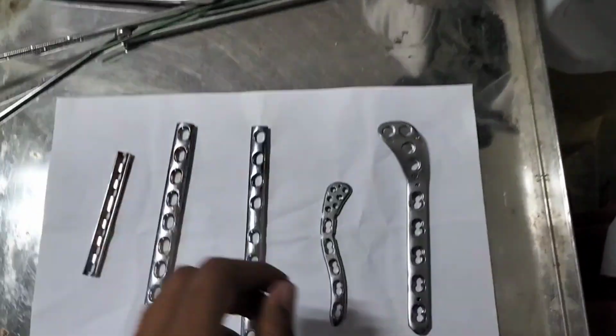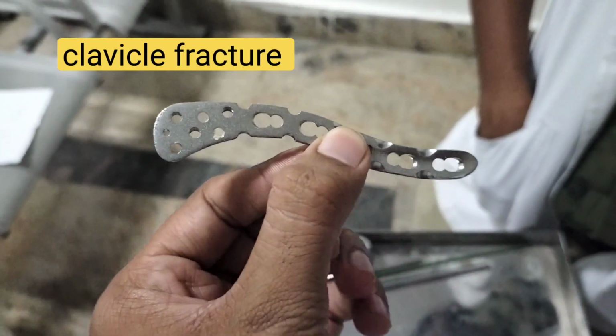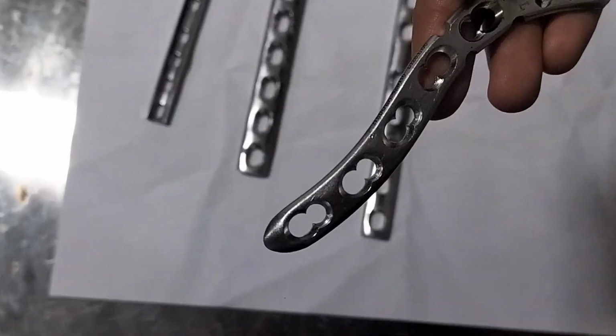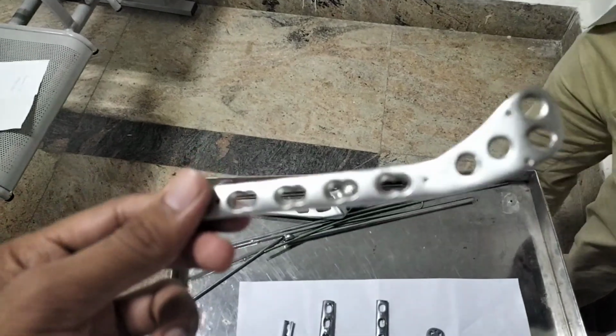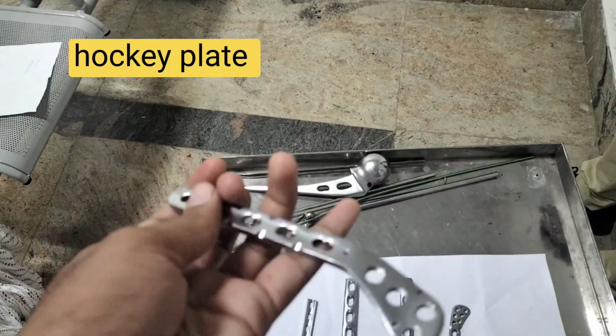Now coming to these two plates. This is a plate which is used for a clavicle fracture. You can see this is S-shaped, and at the inner margin there are small holes. This is the last plate. This is the hockey plate, which is used for proximal fracture of the tibia.